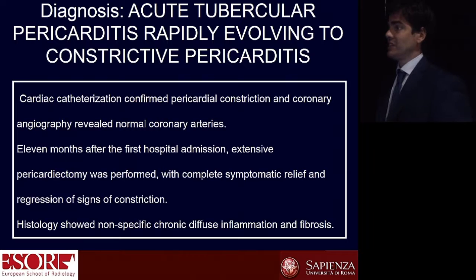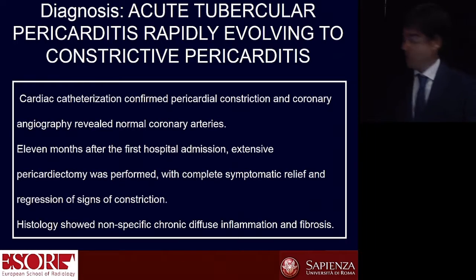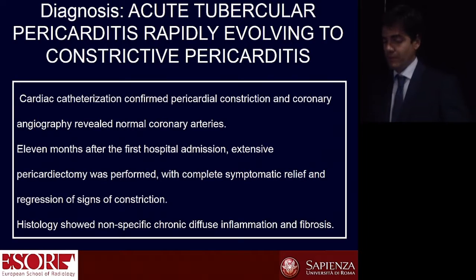And one fast case, it is a CT case. Why, you say, are you showing us a CT case in an MR meeting? Because I saw this guy last week. I was shocked a little by the case, so I want to have from you just a light diagnosis, because it regards pericardial disease. No comment from my side, just tell me what happened.